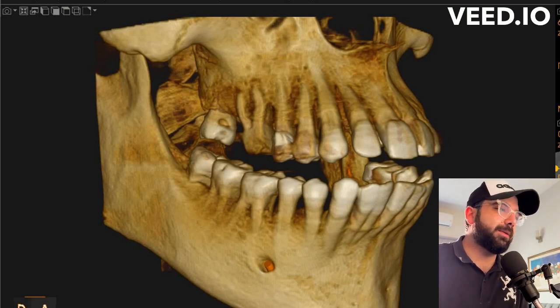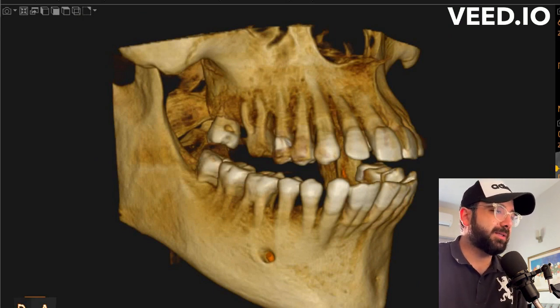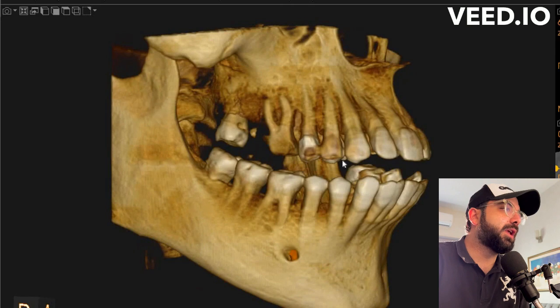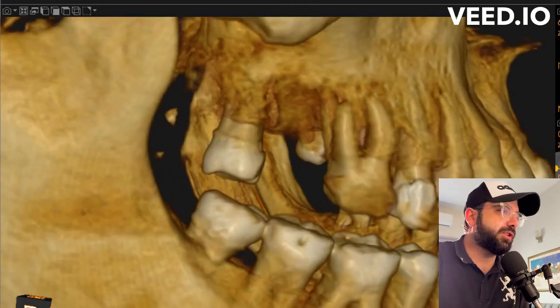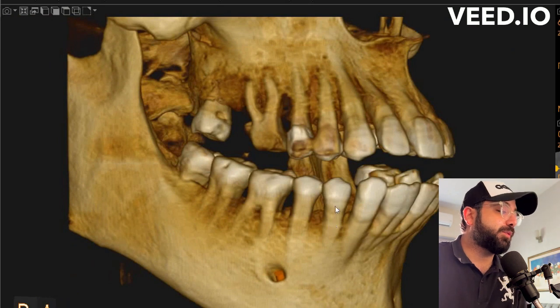So I wanted to place an implant virtually and show everyone how we do it and how it helps us plan our surgeries more effectively. So this is a 3D rendering of our patient. We did a bone graft in this region approximately 4 months ago, and now the bone has developed quite comfortably and quite nicely. And an implant placement is definitely possible.